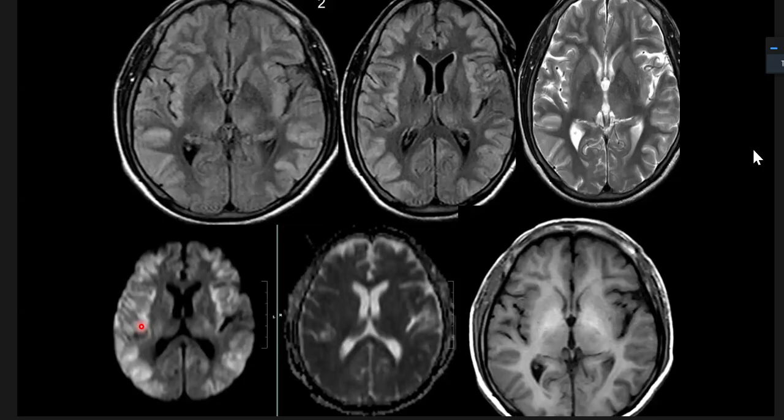Is it symmetrical? Symmetrical, sir. Excellent. Is it involving cortex? Yes, sir, more on the cortex. Does it involve white matter? No, sir, white matter looks fine. Excellent. So we have cortical restricted diffusion or brightness on DWI images. Do you see everything is involved or is anything spared? And what is happening on T1 weighted images? Tell me about cortex, basal ganglia, thalami. Is anything spared or not? These are the 5 points I want to know, and anything you are seeing on the T1 weighted images.